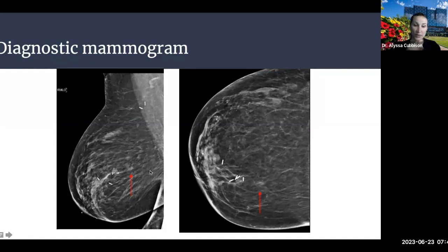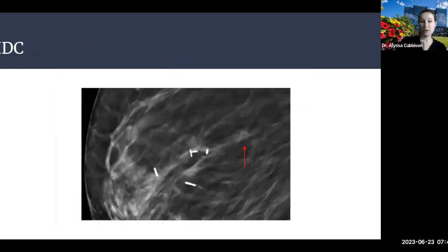On a subsequent mammogram follow-up after her lumpectomy, this focal asymmetry was found to be posterior to the lumpectomy bed, certainly quite subtle. Attention was drawn to it just because of its new nature. And then tomo, again, very, very subtle, but this was found to persist, and this was actually a recurrence at the lumpectomy bed, unfortunately. So this was invasive ductal.